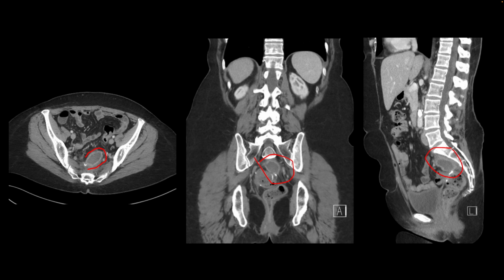And so when there is dehiscence of the sutures and some material leaks out into the intraperitoneal compartment, then it can develop into an abscess, and that's exactly how it would look. So a post-surgical abscess from sutural dehiscence.